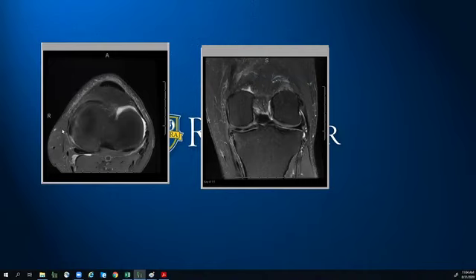So this is what's referred to as a flap tear, meaning that you have a displaced flap of meniscus material, not the entire meniscus, just a displaced flap, usually from the undersurface, getting displaced into one of the gutters. Now, the difference between that and one of the flipped meniscus tears, so I'll load up one of those. So we'll look at Caffrey again.